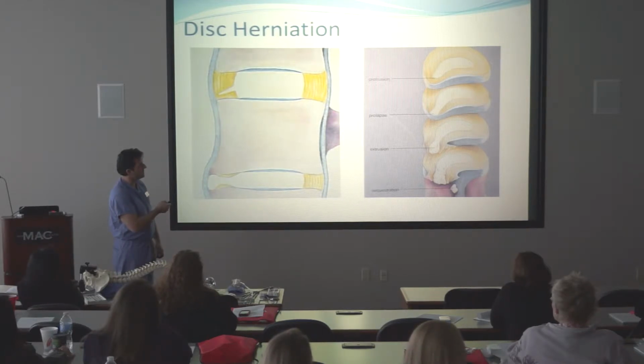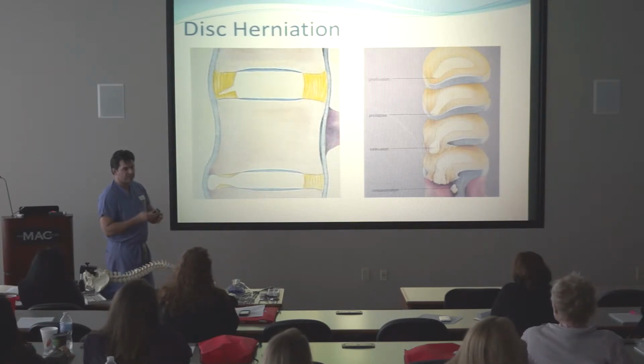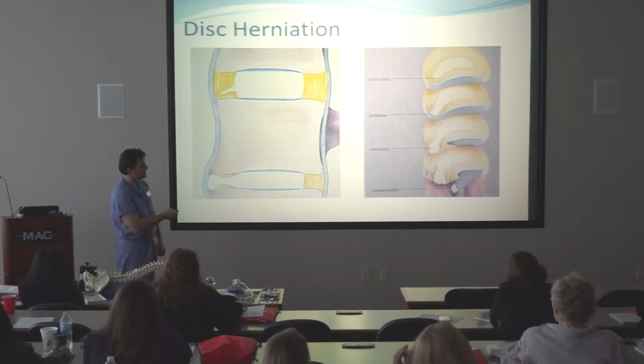You have a little bit of bulging disc, protrusion they'll call that, prolapse. You don't ever really see that so much anymore. You just see protrusion or extrusion. So the way to kind of get a clear handle on that, protrusion is when the annulus hasn't been ruptured itself. There's a bulging disc, the annulus is weakened and it's bulging, allowing some of that material to bulge back, but hasn't broken through. And then down here, the extrusion, it's now broken through and actually squirted out.